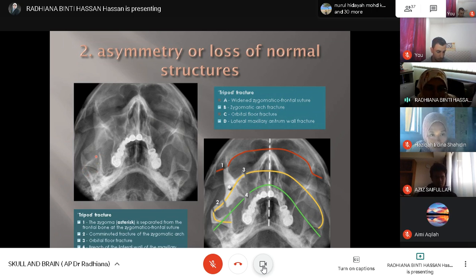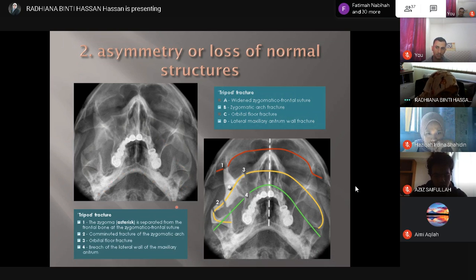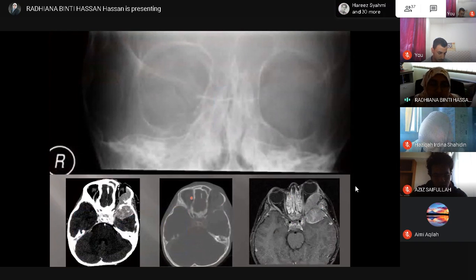So it's condylar and coronoid process, whether any fracture or not, and then again look at the maxillary sinus and look at the nasal region, the nasal septum, and also the lucency within the nasal region, and then the other side of the maxillary sinus, and again the condylar and coronoid process on the other side. And some books put a fourth line here along the lower parts of the mandible to look for body of the mandible fracture. So that's when you have an approach.